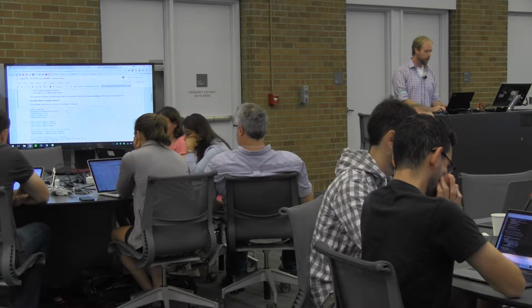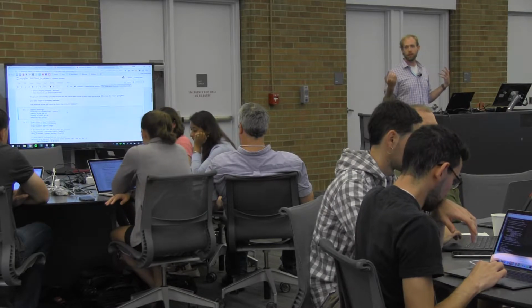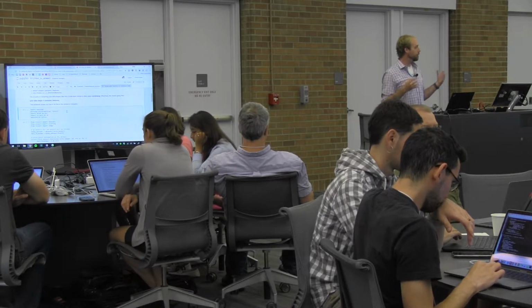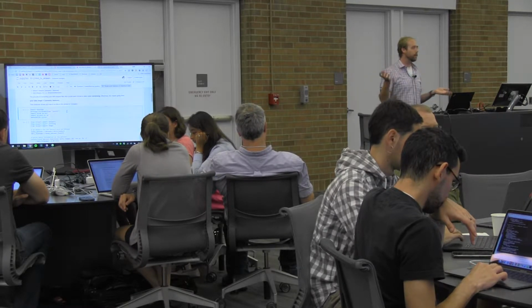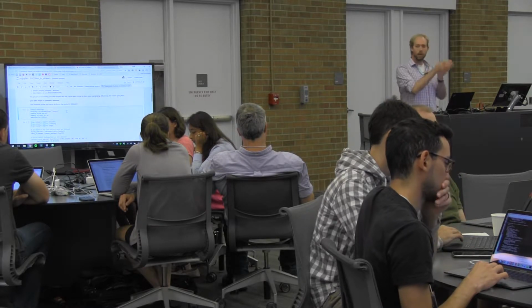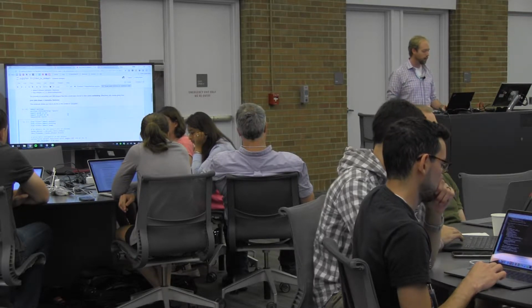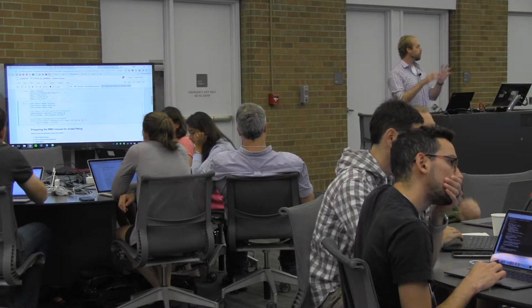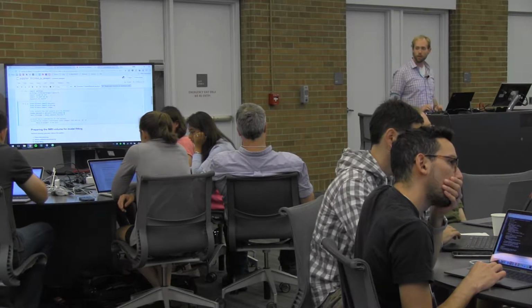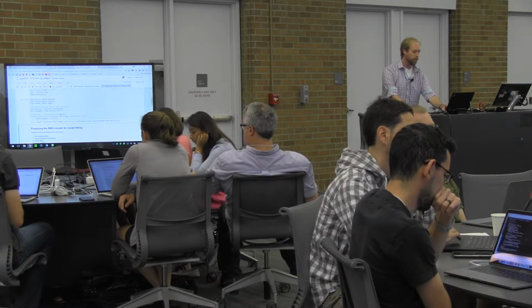So the trick is that we want to do that in a way that doesn't obliterate our knowledge of what all of these features actually are. If we take this nice four-dimensional array and we unwind it so that it's samples by features, it can be really hard to keep track of what each of those different features actually maps onto. So the easiest way that we handle this using nilearn is with a collection of classes that try to do some of this magically for you under the hood so that you don't have to think about it as much. So to motivate this, we're going to use a new data set.